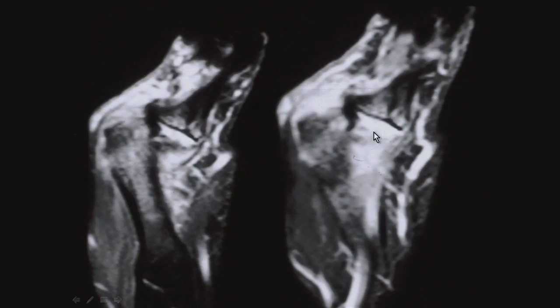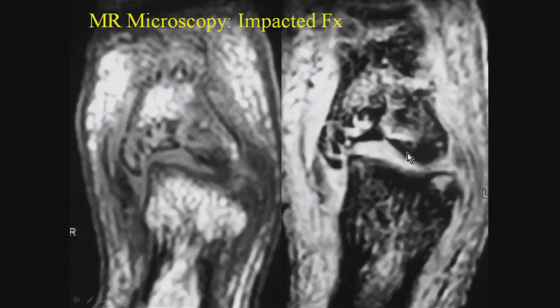And then finally, we see the cause for the inability to reduce this dislocated thumb. It's this fibrocartilaginous structure sitting here and here, which is the volar plate, which is torn and interposed between the first metacarpal and the proximal phalanx. So a lot of very useful information to the hand surgeon preoperatively to understand what sort of reconstruction is going to need to be done and why it was not possible to reduce that thumb clinically.